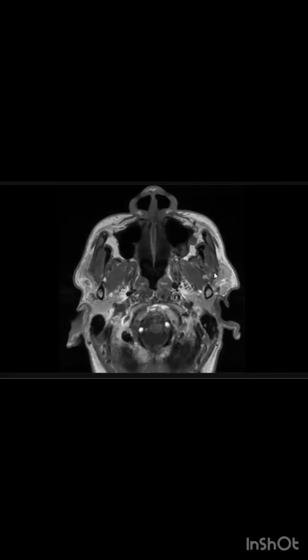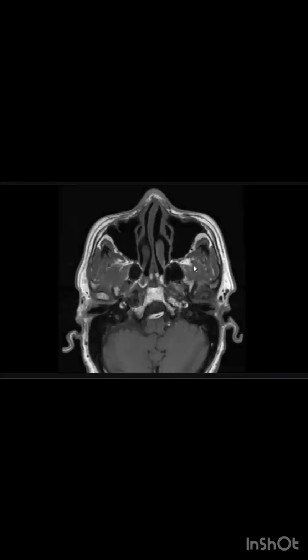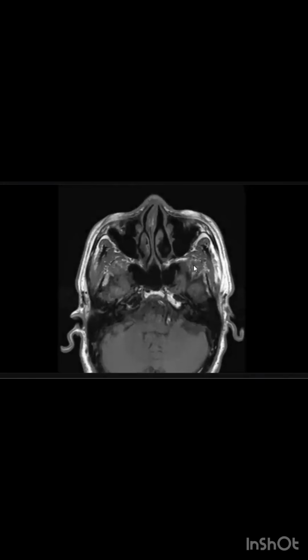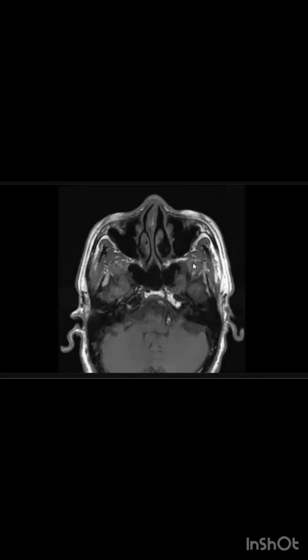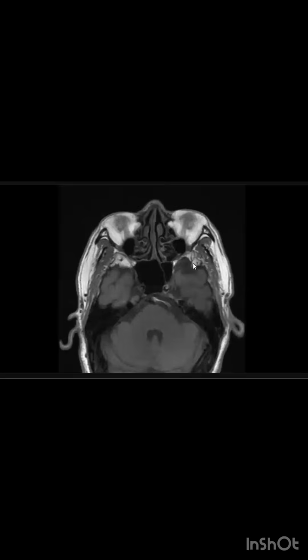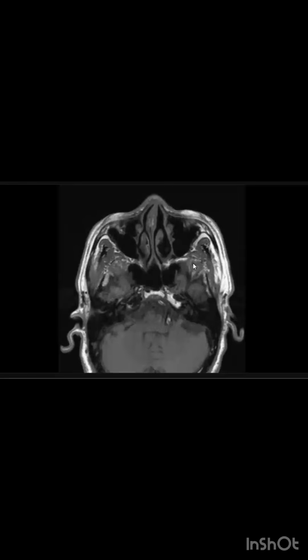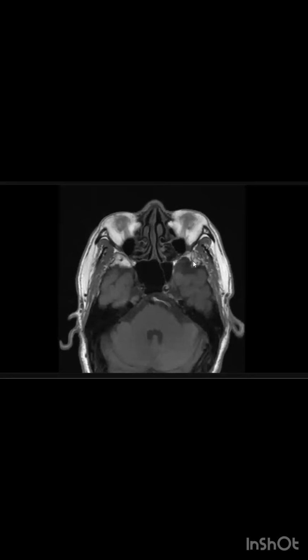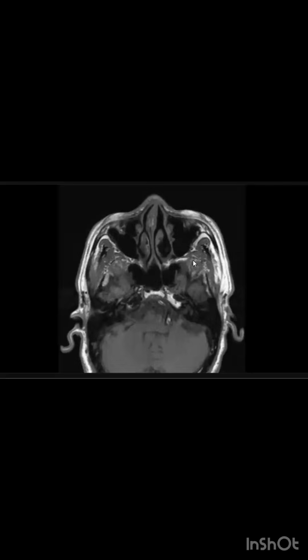Anything else? Apart from that, I can also appreciate that there appears to be some increased signal intensity in the region on the right side.